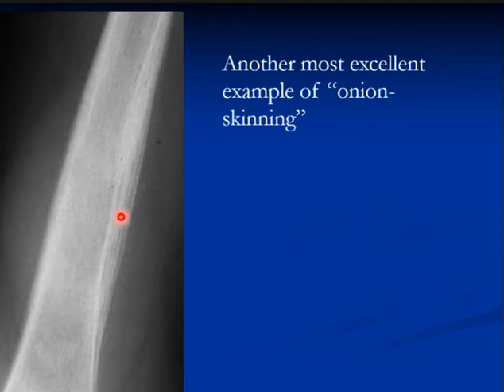Lymphoma comes with a big soft tissue component, but it's possible in the differential, but much rarer, primary bone lymphoma, than Ewing or PNET, especially in this age group. And it is intramedullary mostly. Lymphoma, leukemia mostly intramedullary. Ewing is also intramedullary, but lymphoma and leukemia, primary bone lymphoma, they are very rare. I've seen only few cases, 3 or 4 cases, and usually presents in older age group around 40, 50, 60, something like this.